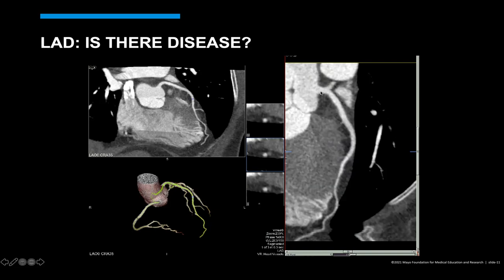This is a normal looking coronary artery. We do not see any non-calcified plaque or calcified plaque. As you pointed out, there might be a short segment of myocardial bridging here in the middle to distal left anterior descending artery. In general, if you were reading this overnight on call, you would call this negative.